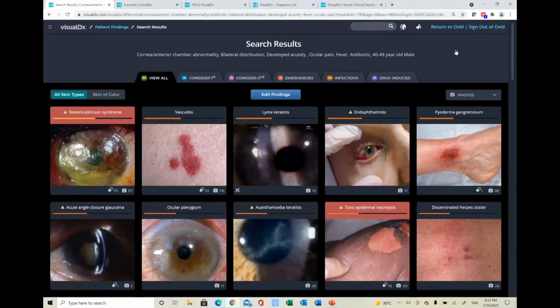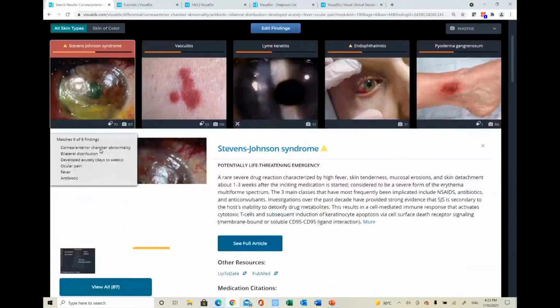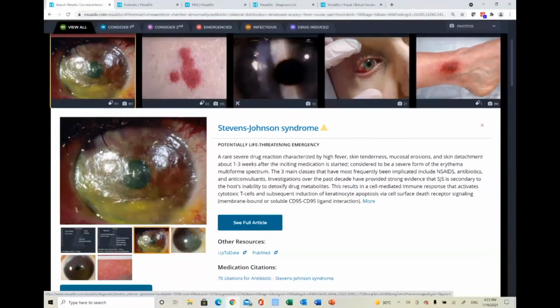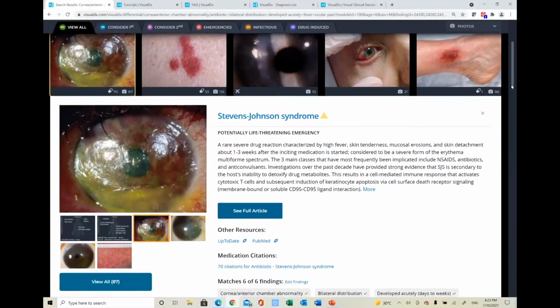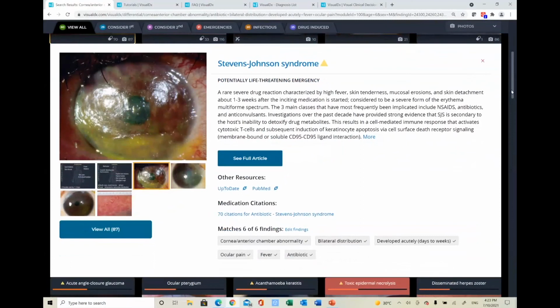Definitely, it has reorganized them on the screen, and to be able to find out more, I'm beginning to choose the one that seems to be potentially the one that might be the issue. I can begin to read and look at that particular problem, and I can note that this is rare. So I may need to go back and look at more detail and maybe ask more questions later on.